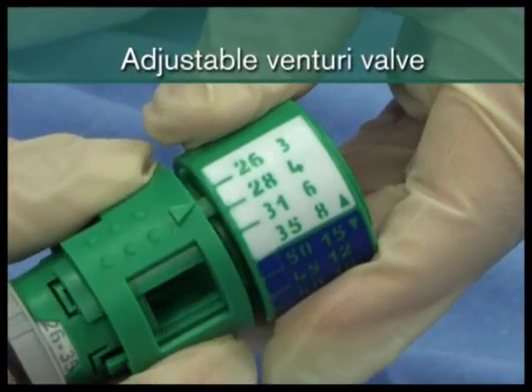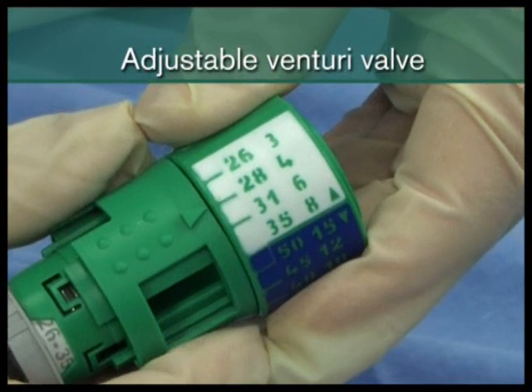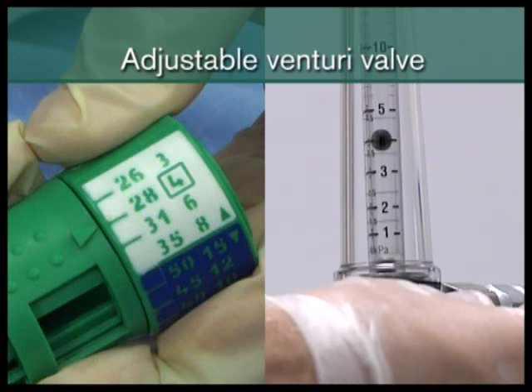Select the desired oxygen setting by rotating the oxygen adjuster. Set the oxygen flow meter to the flow indicated adjacent to the oxygen concentration.